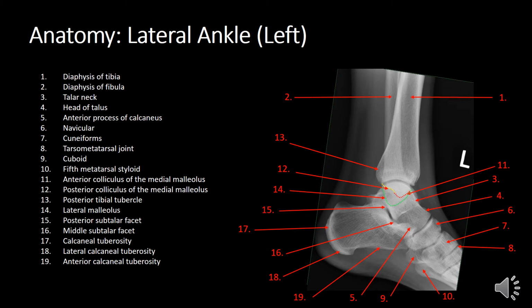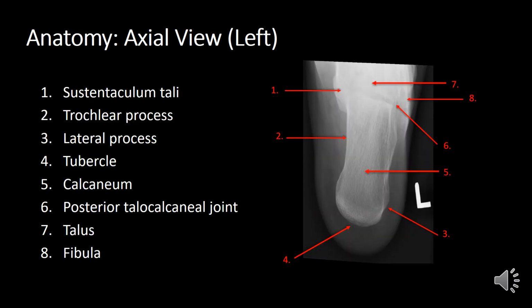And here we have the lateral view. Again, you may wish to pause the video, take a little bit of time just to remind yourself about the normal anatomy before you proceed. And finally the axial view. Again, pause the video, just take a little bit of time to make sure you're familiar with the anatomy before you proceed.